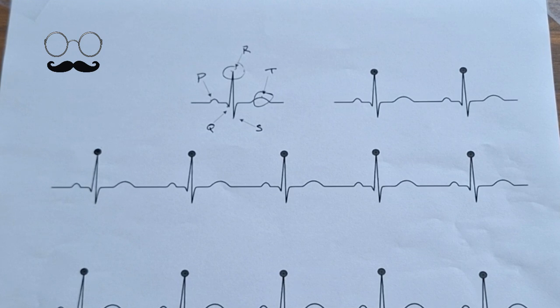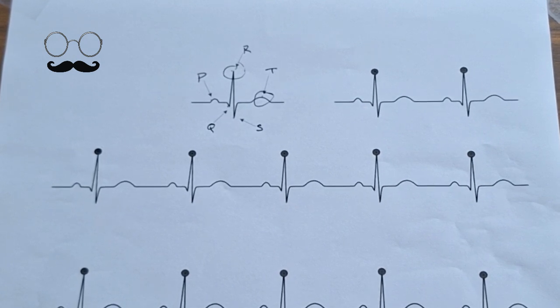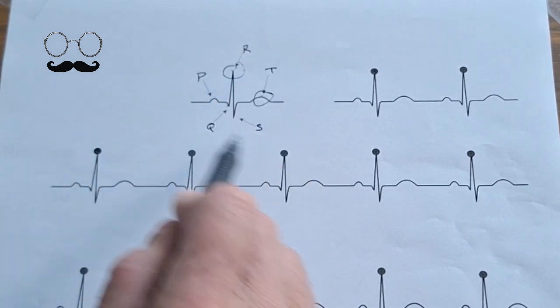Now, where it is super important is when you're setting up your patient and bringing those arms up before you put your ECG leads on, because the ECG placement is going to matter. Plus, the different types of leads that you use also matter, and we will cover that in a future video as well. So for today, understand where everything lives.